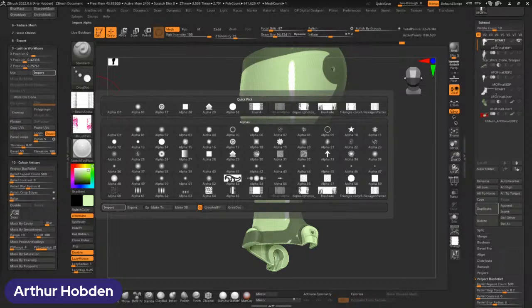And so you're sort of creating variants where the proportions based on the canvas size are going to be different. So if I take a square canvas or a long rectangular canvas, it doesn't matter. It's going to map across the same surface each time, and it's just going to wrap it corner to corner, regardless of the size it is. It's all about the proportions, the ratios of it.